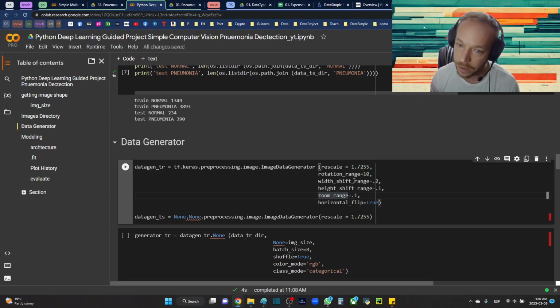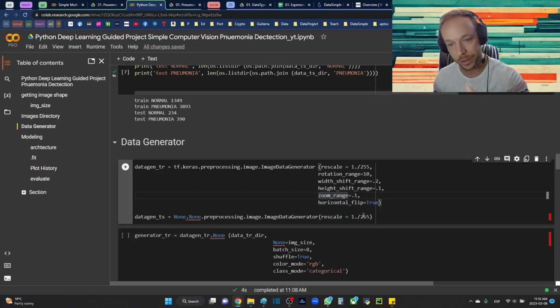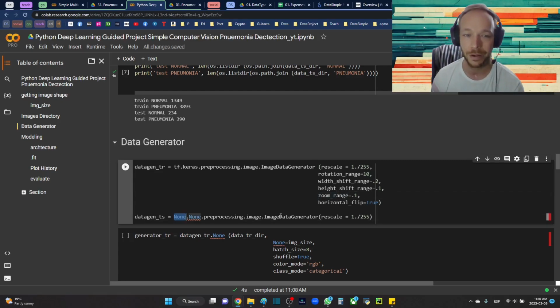If you play with any of these too much, you're going to notice your model just starts not really training very well and stuff like that. So you could try increasing these, but do one at a time. So really notice what's going to affect you. I almost guarantee you, because I do this a lot, I'll think, oh, let's turn all these up. And then the model doesn't train well. So then I have to go back and do one by one. So it's just giving you some advice. Start with one by one, and you'll end up saving a lot of time.